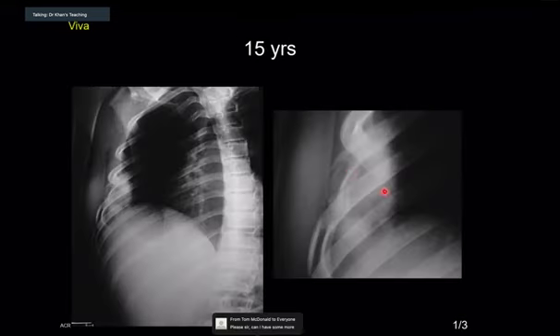This case is okay. You describe it, and then I'll just ask you a few questions. Okay, so I've got a frontal radiograph of the chest of a 15-year-old, and I can see there's a lucency projected over the right hemithorax. Forget about this, this is projectional. Just concentrate on the strip, please.